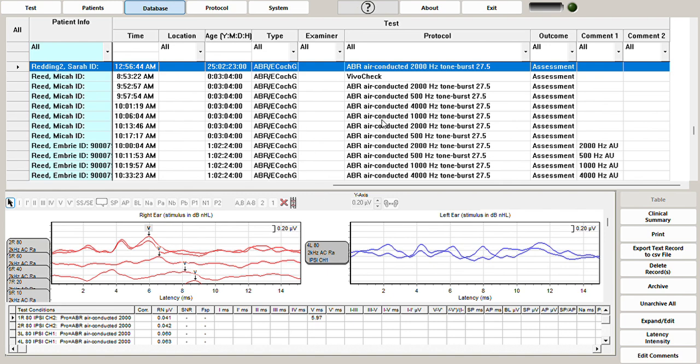A lot of times when you're doing this, you'll get a lot of runs. You will want to hit the H button instead of the delete button, unless you know for sure that's not a waveform you want to keep. Also make sure that the bubble here, the little handle, is actually selected for the one you want to delete, so that you're not accidentally deleting the wrong one. So just be careful when you're doing that.